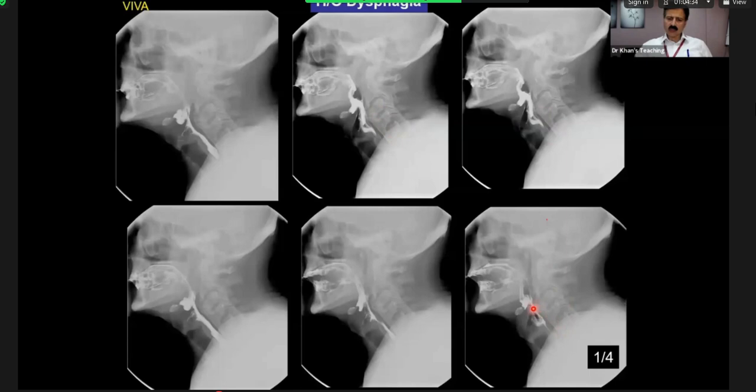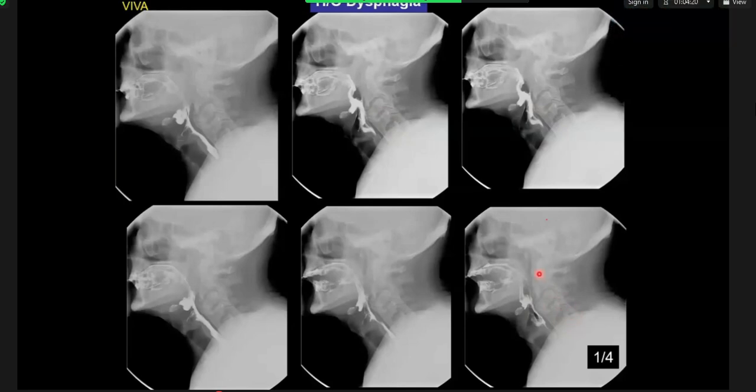You are right that it is indenting the esophagus. So this picture, what comes to your mind? The posterior elements, etc., are absolutely fine. Look at the intervertebral discs; they are absolutely fine. So anterior longitudinal ossification. What is your diagnosis then, please? Ankylosing spondylitis. Ankylosing spondylitis will cause syndesmophytes, which will be just here. This is too big.